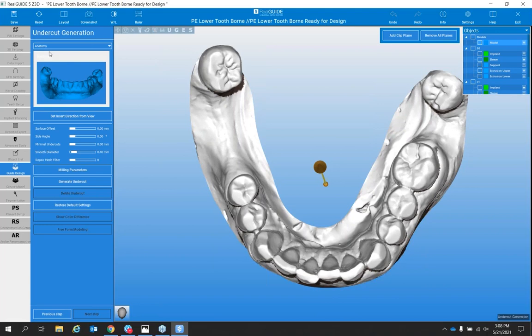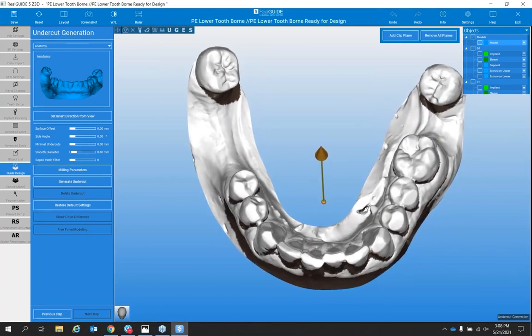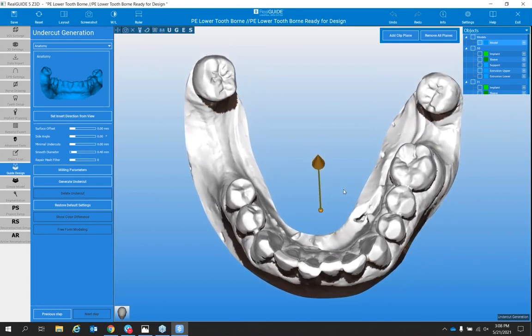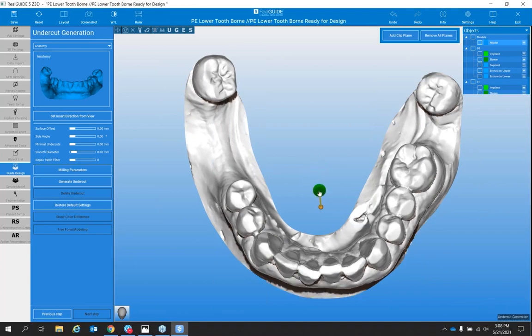And from here, I can begin to maneuver and position my model to where we can create a good undercut. So bring it to our model here, drag over our mouse, just hovering above it. Using the left click, we're able to rotate our model, set our path of insertion, and then using this cone here in the middle, we can left click on that and maneuver it to where we create our block out, getting rid of all this excess here, the dark shades we see there.